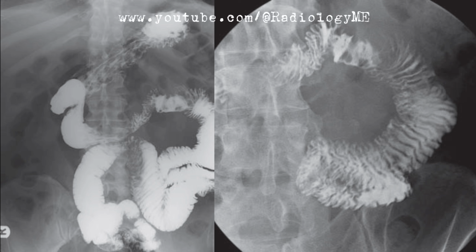All right, let's dive into this case like we're in the FRCR 2B exam. As I start analyzing the images from this barium follow-through study, my attention is immediately drawn to the solitary focal abnormality at the duodenojejunal flexure. The mucosal fold pattern is obliterated over a short segment, replaced by a smooth pattern with a hint of nodularity.